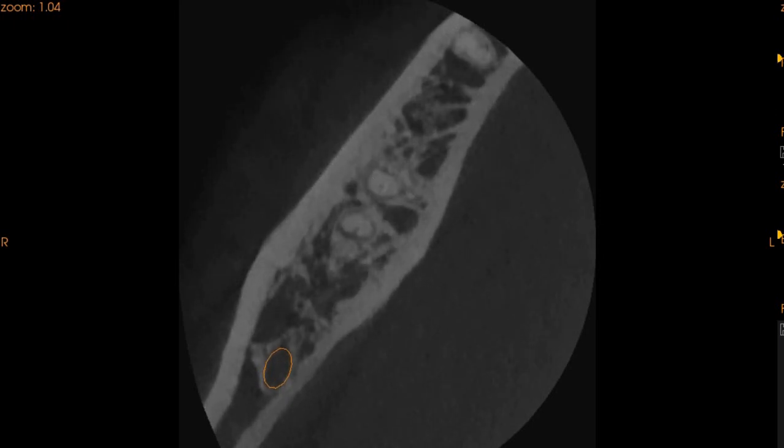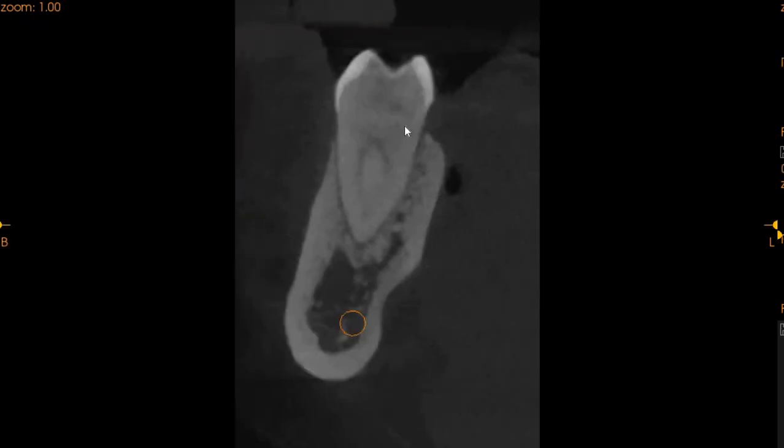Now we will show you the tooth from a transaxial view. This is the transaxial view. We can see that these are the two canals. They are one initially, then we can see they separate as two, and then they join to form one at the apex right here. The estimated working length for the mesial canals is going to be 19.5 millimeters.